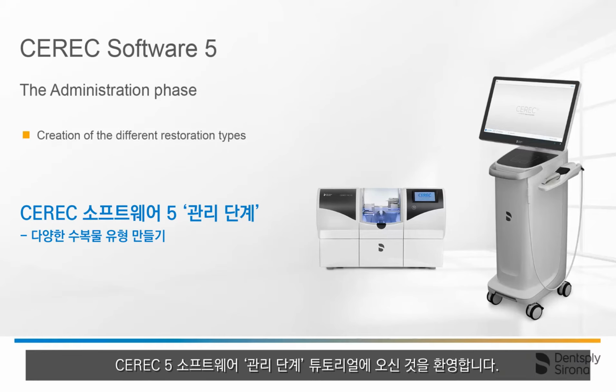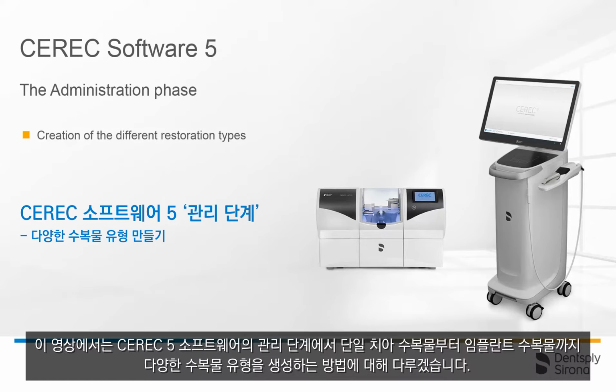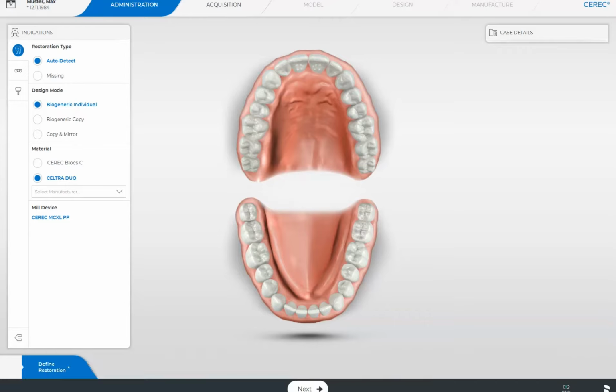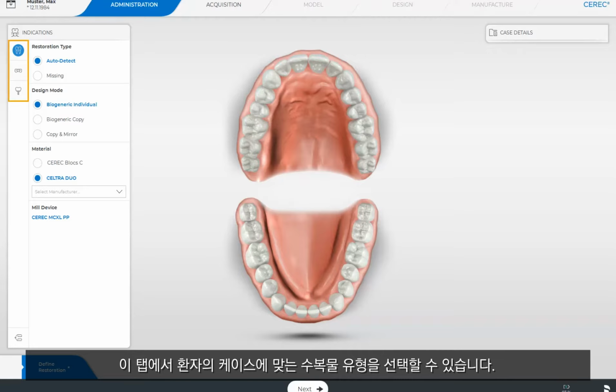Welcome to this video tutorial on the topic of the administration phase. In this tutorial, we demonstrate how you can create the different restoration types, from single tooth restorations to implant restorations, using Cerec Software 5. After we have entered our patient data, we are automatically moved to the first phase, the administration phase. In this phase, we define the restoration type for the respective patient case.